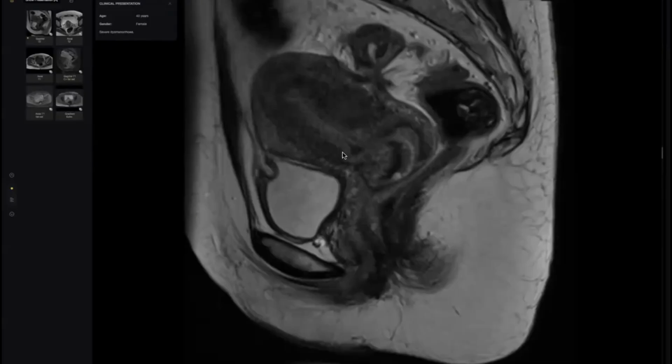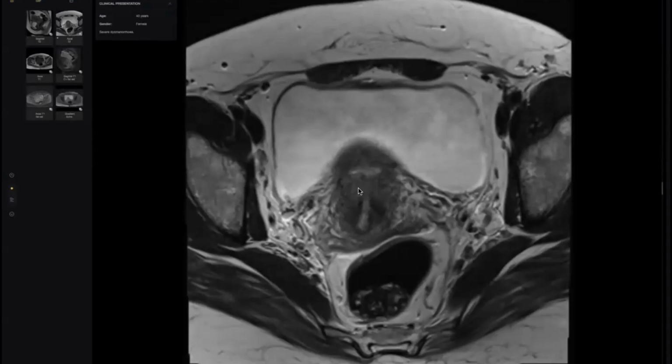Dr. Roshni, you have too much knowledge in your brain. Don't hesitate. You are correct. From the beginning, when you were starting, you were talking about this, and then I perceived your hesitation. Don't hesitate, you are correct. This is the axial T2. Continue, please.